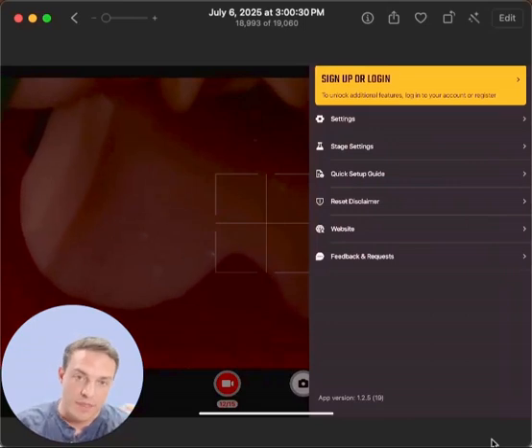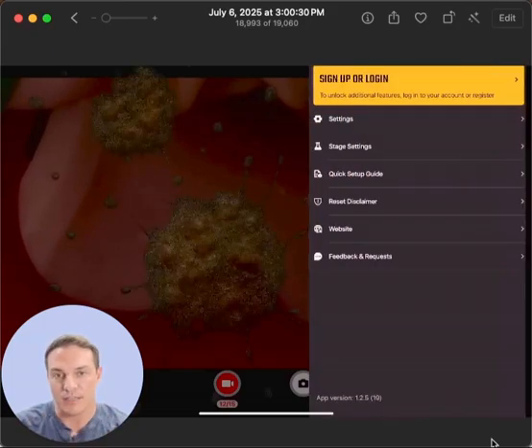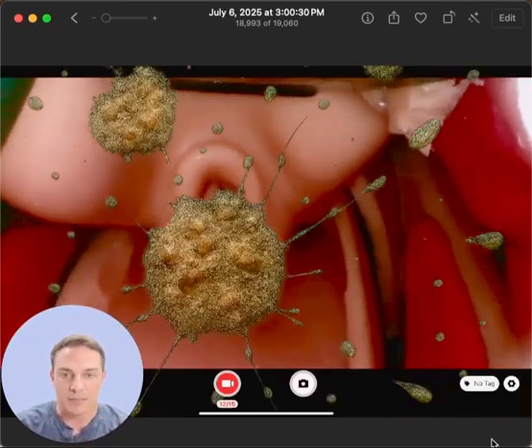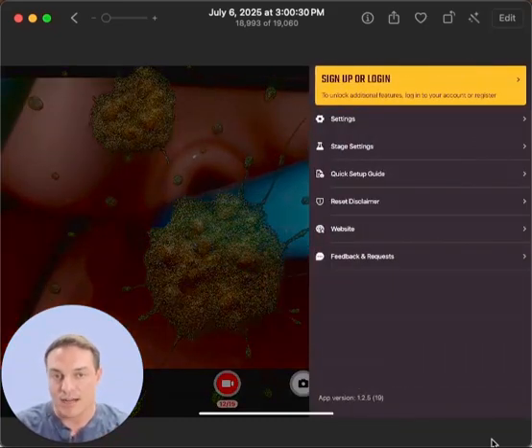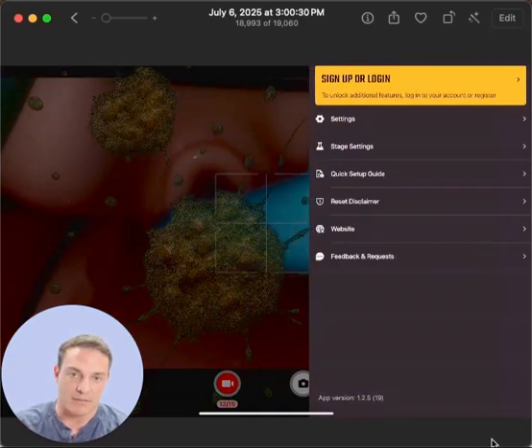With that, in the same vein, another thing we're working on is the ability to add overlays. So to put in, for a simulation, blood, spit, vomit. In this example, I picked vomit to obscure that intubation. As folks in this space understand, it's not a very clean environment. Sometimes you can get blood that really impedes your ability to perform that intubation.